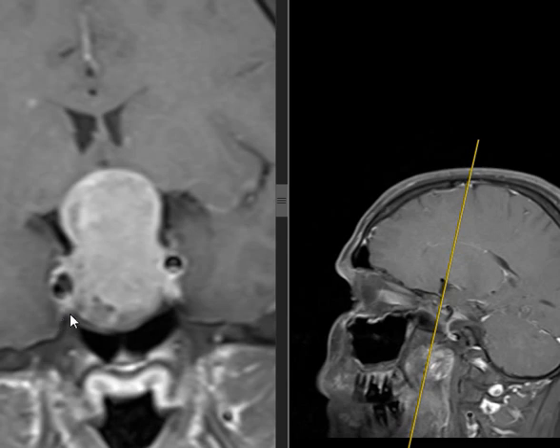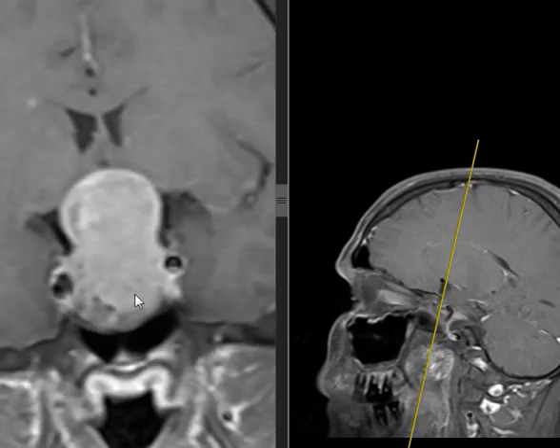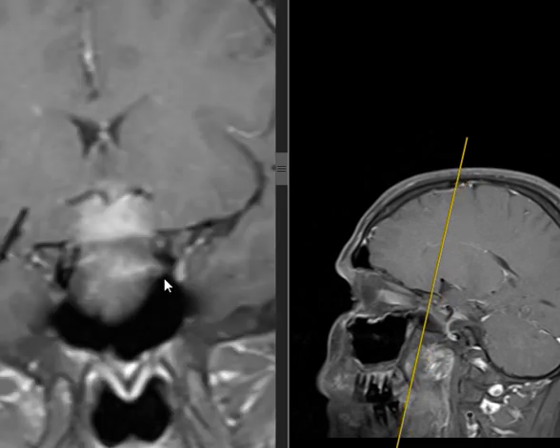There is an enhancing soft tissue extension of the lesion around the right ICA. This will change the surgical approach, it will change everything. This was surgical and becomes medical. You cannot remove the ICA. Okay? That's first. Second, this side, probably yes, probably no. There is a little bit of enhancement, I'm not sure. But the right side is definitely encased.